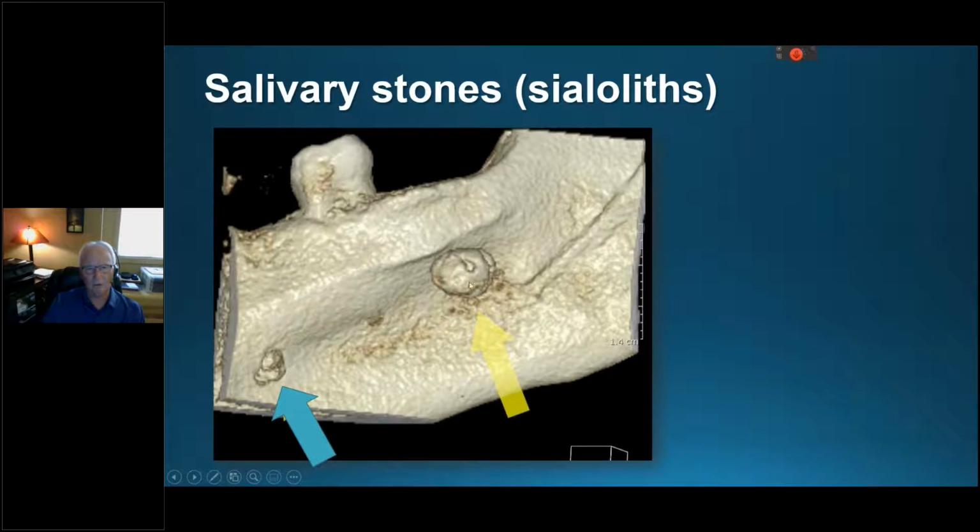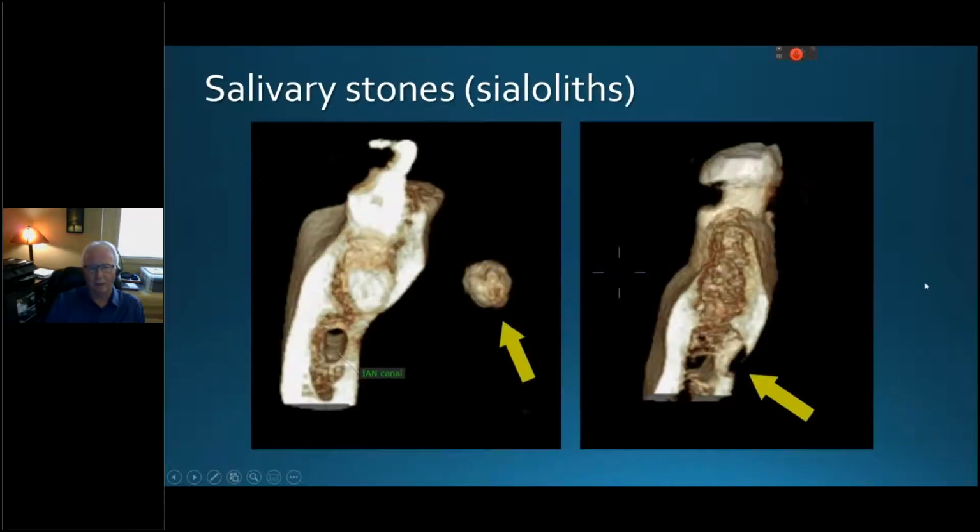But there's the stone, a large submandibular salivary gland stone, and it's probably at the hilum. The gland is sitting here and the duct's coming up and running along the floor, and most likely this is right at the hilum of the gland. And you can see this isn't sticking out. This is actually a defect going into the bone. This is the Stafne defect, or lingual developmental submandibular salivary gland depression. We'll see another one a little bit later on.